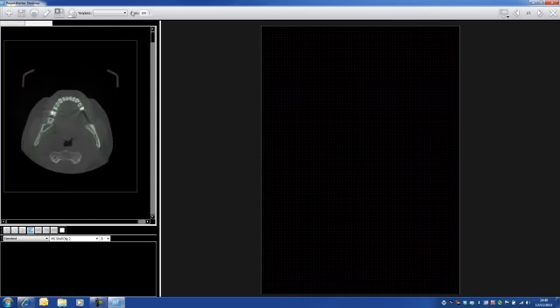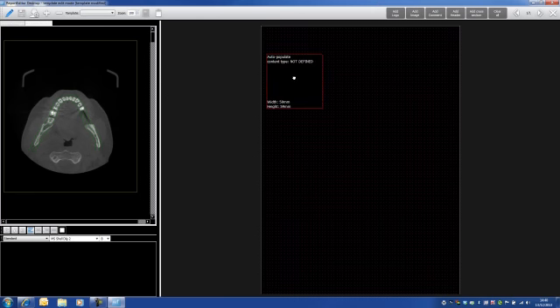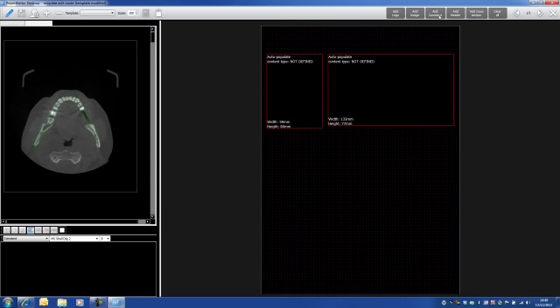There we go. And now, of course, I have no template here, but I can create them. So let's create one template to make your report. I go here on edit, the little pencil icon. I go add image. Let's put one image here, one image here. This one is going to be the panoramic, let's say. This one is going to be the actual view. I can add a header with the name of the patient, name of the doctor. There we go, just put it here.